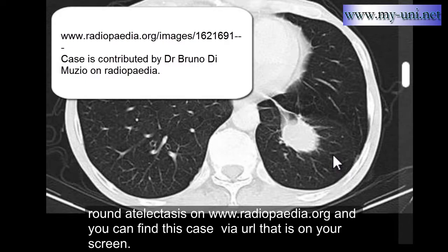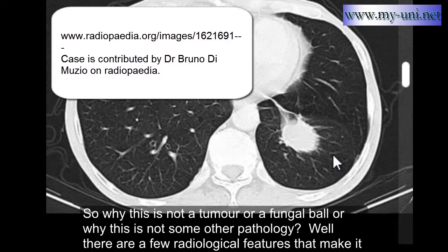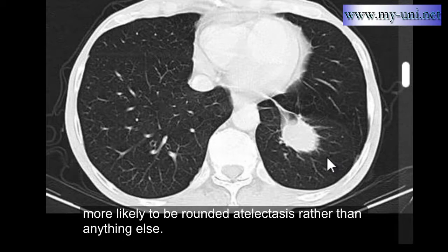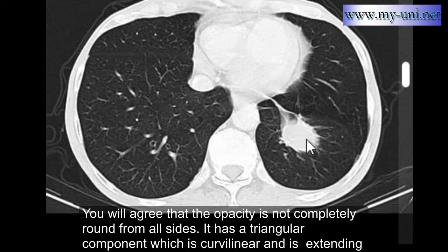www.radiopaedia.org, and you can find this case via URL that is on your screen. So why is this not a tumor or a fungal ball, or some other pathology? Well, there are a few radiological features that make it more likely to be a rounded atelectasis rather than anything else. You'll agree that the opacity is not completely round from all sides.